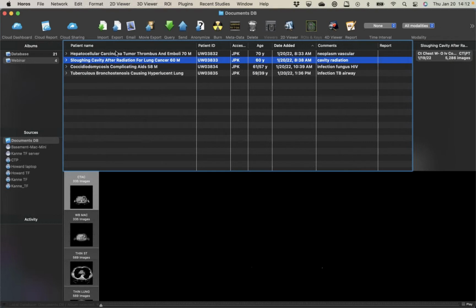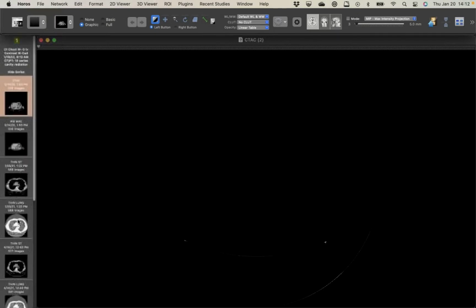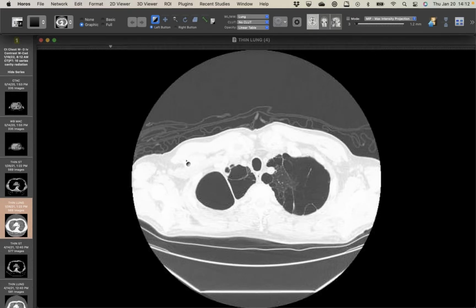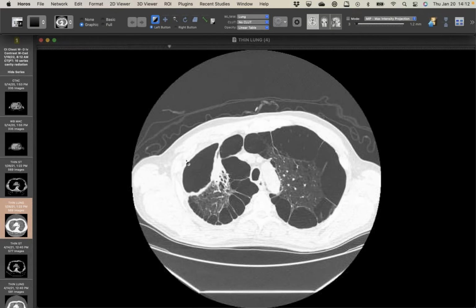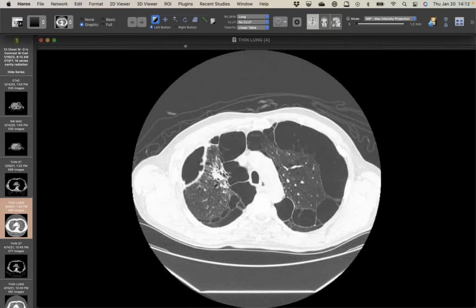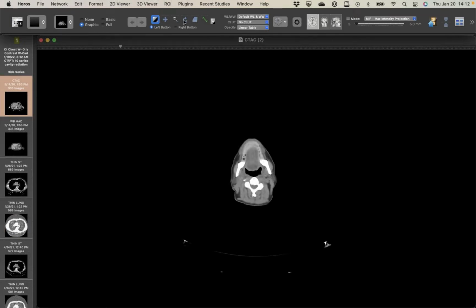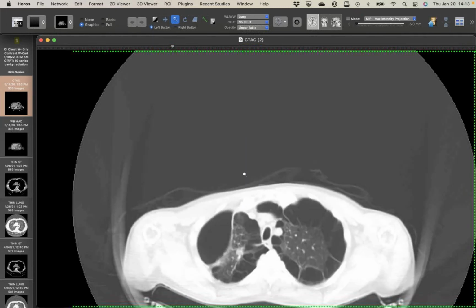This last case is kind of crazy, and I'm not 100% sure what's going on, but I have a good thought. So this patient, I gotta find the oldest imaging. This patient has a long smoking history and had a head and neck cancer. And at the time of staging of that, you can see he has this chronic cavity in the right upper lobe. We gotta actually go to PET CT first. Yeah, so on the staging PET CT, there was a nodule identified in the right upper lobe right here. There were no previous chest CTs at the time, and this was FDG avid.